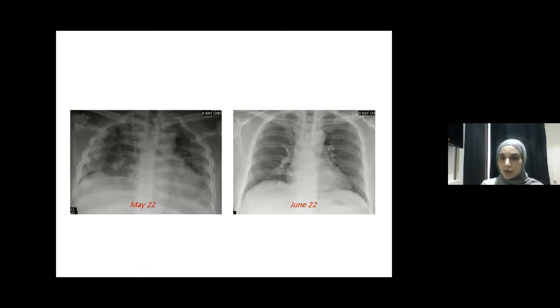Follow-up post-discharge, after treatment and getting a negative swab, the patient's chest X-ray turned out to be completely normal, with no residual fibrosis as well.